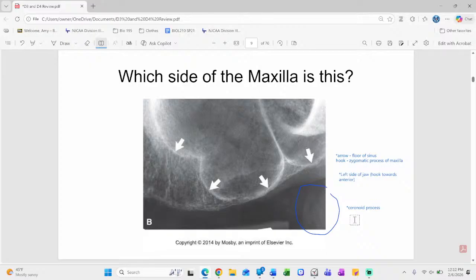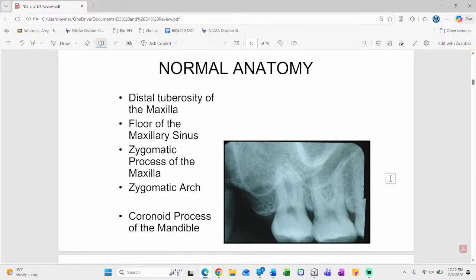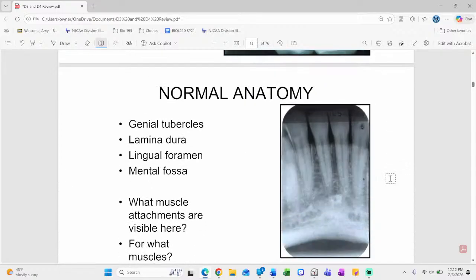A little bit more anatomy. Holler if you want me to stop and go over something. So it's that posterior, a lot of stuff going on up here that maybe you marry it to the skull then.